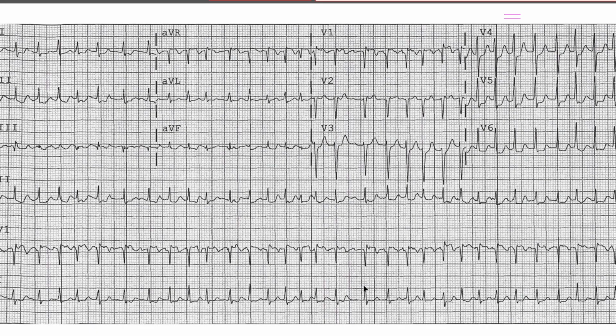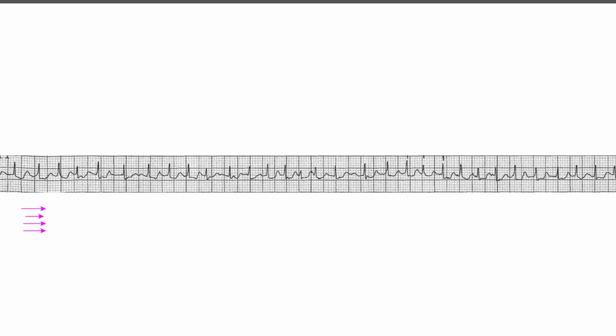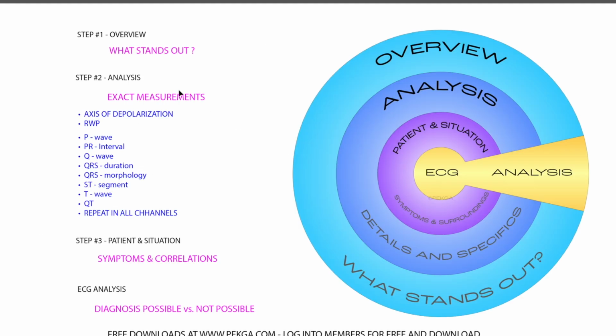Today we're going to be discussing this 12-lead ECG, and if you've gone to the rapid session, this is a deep dive session, so if you've gone to the rapid session, feel free to skip through the first couple of minutes, but we're going to break this down and start off with a single lead. Before we get to it, I want to remind you, work on your method, no matter what it is. Doesn't matter if you're taking somebody else's, just have something handy.